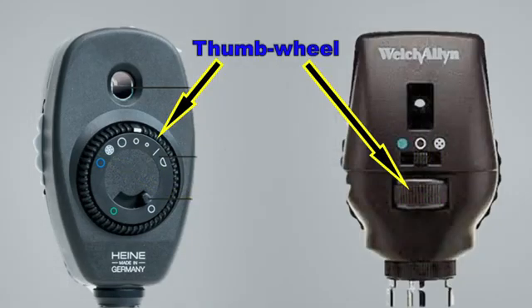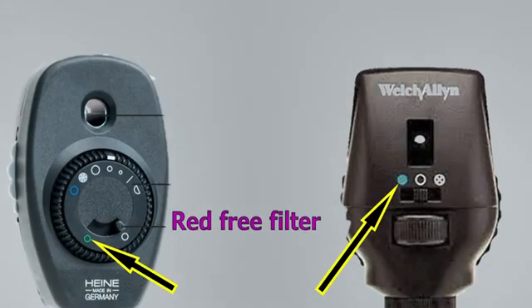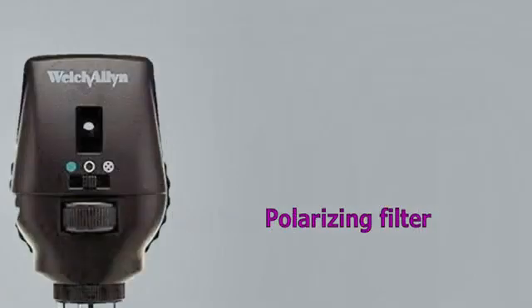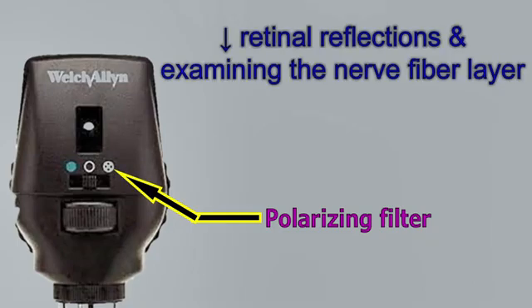These are available via a thumb wheel. All of these may be combined with a red-free filter to help in better visualization of blood vessels, hemorrhage and the nerve fiber layer. Some ophthalmoscopes also have a polarizing filter to reduce retinal reflections and examine the nerve fiber layer.